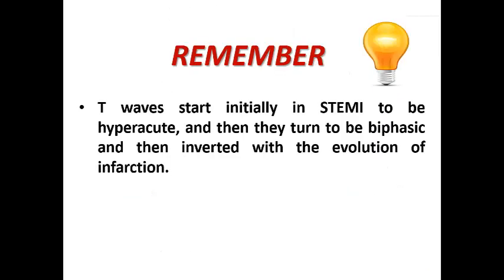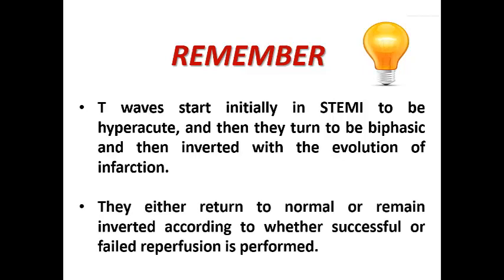So remember, the T waves start initially in STEMI to be hyperacute, then they turn to be biphasic and then inverted with the evolution of infarction, and they either return to the normal baseline condition or remain inverted according to whether successful or failed reperfusion is performed.